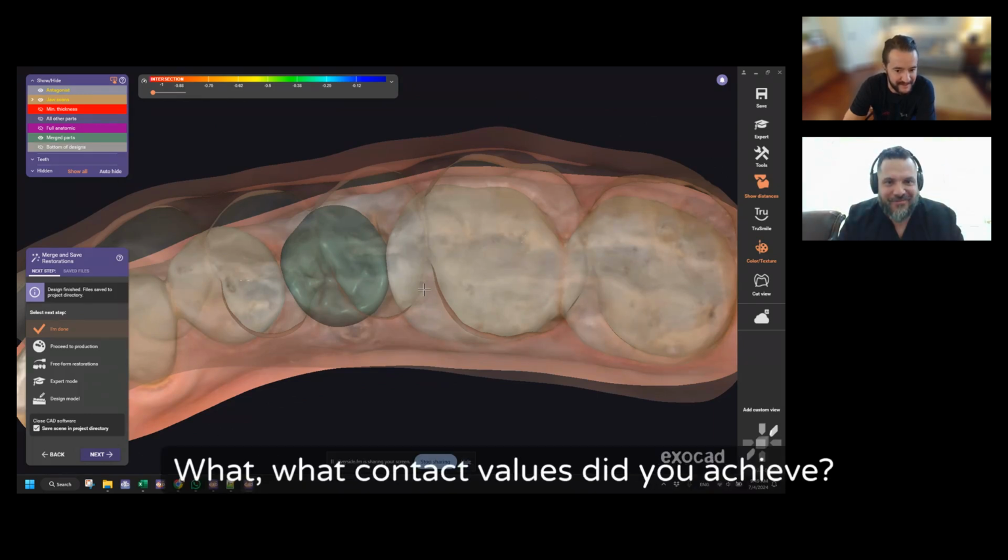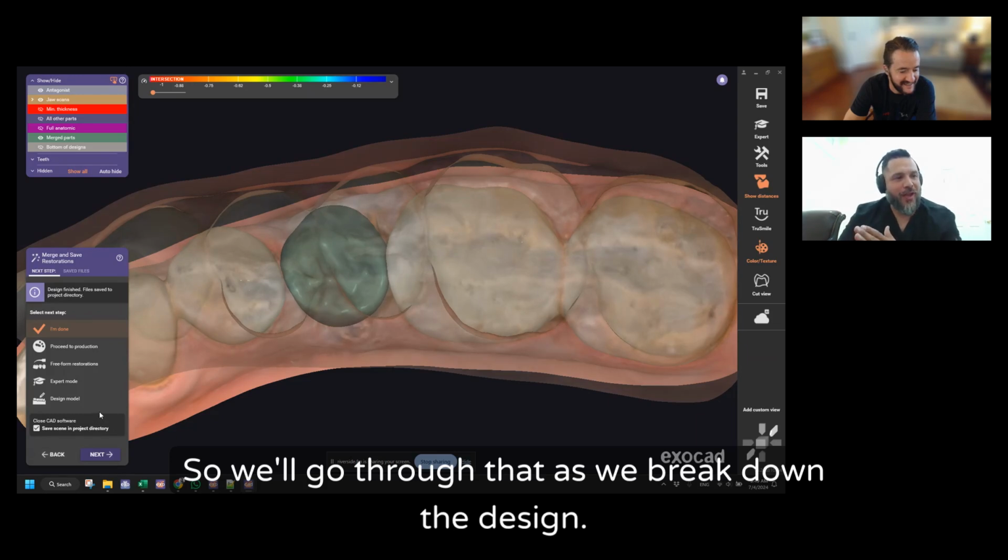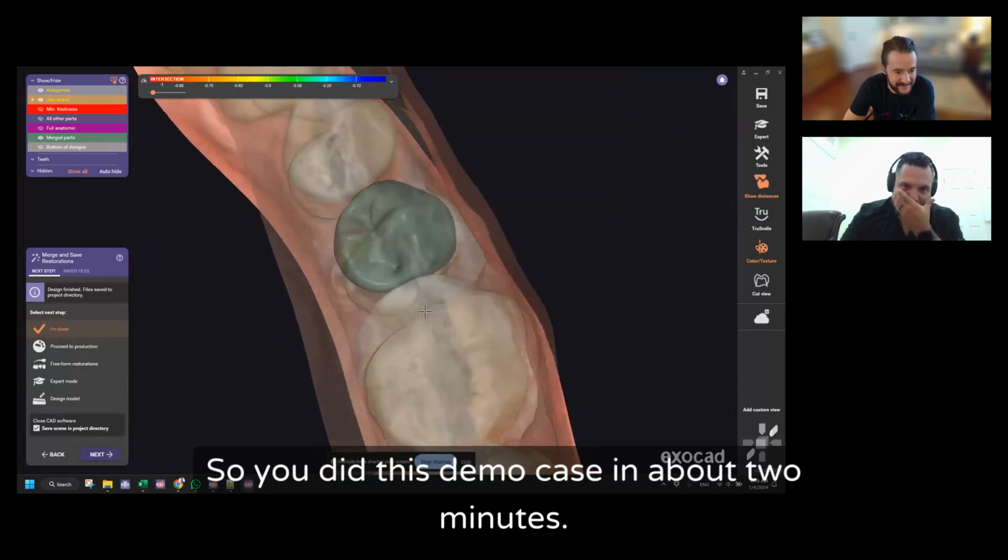What contact values did you achieve? So we'll go through that as we break down the design. Man, so you did this demo case in about 2 minutes.